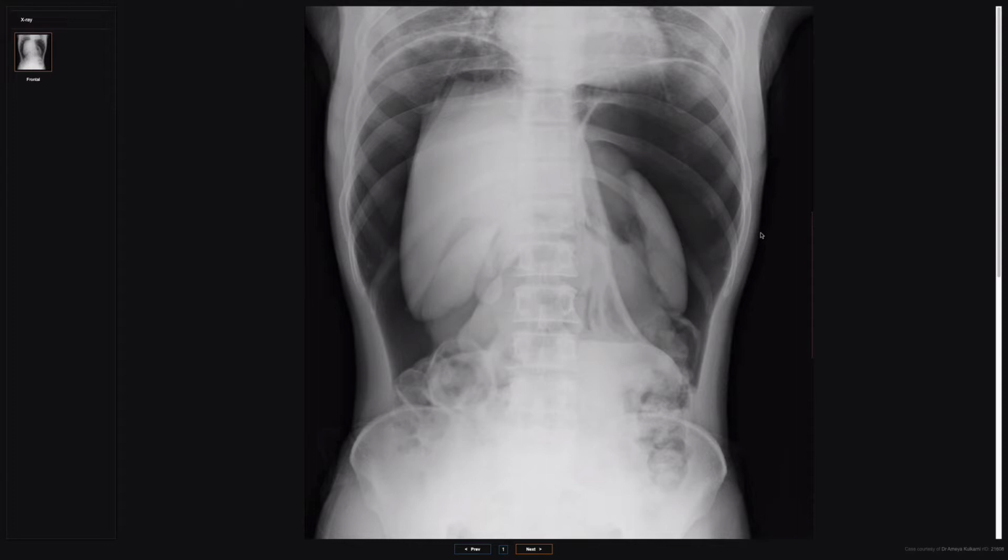So the kinds of scenarios where you might find that happening is, say, a colonoscopy, where they're doing a full thickness biopsy, maybe doing an endoscopic resection. You've got all the gas being pumped in because of the colonoscopy, and then once you've got a full thickness perforation, that gas is going into the peritoneal space, but it's not then being allowed to exit. So what you'll see is that the hemidiaphragms are tented up, and the abdominal wall is pushed out, and all the organs are pushed in centrally into the abdominal cavity.